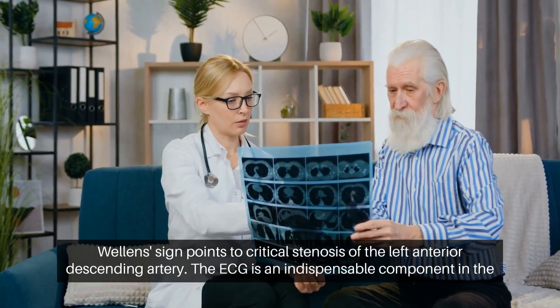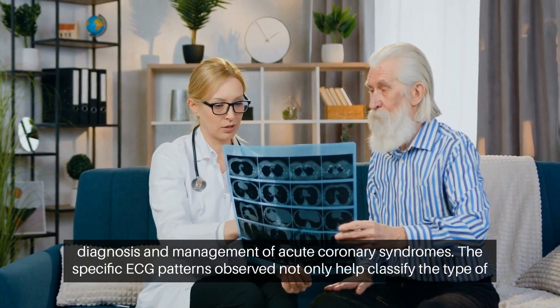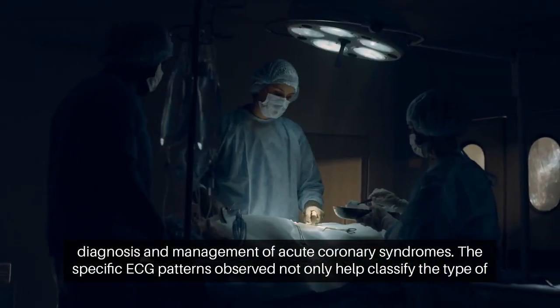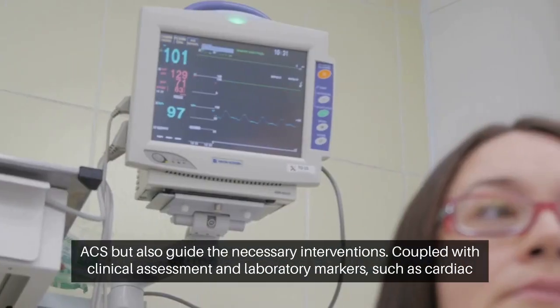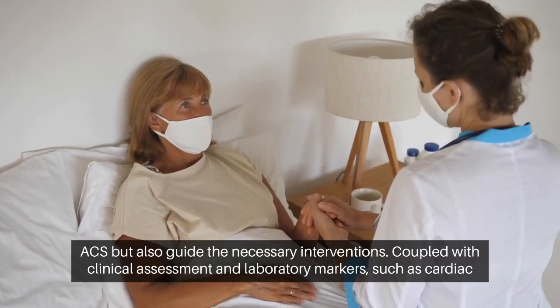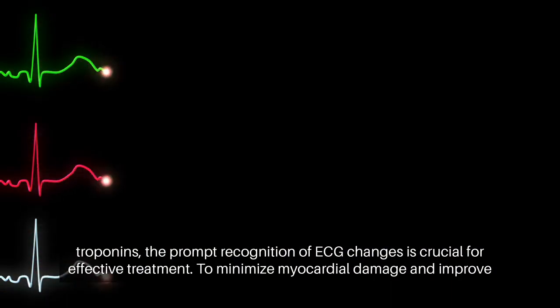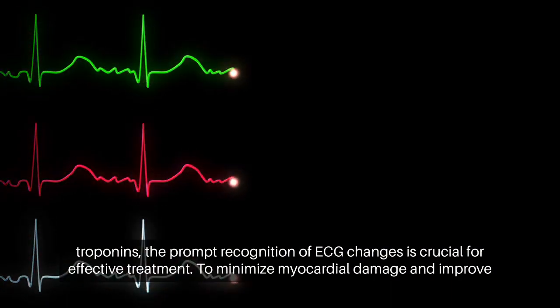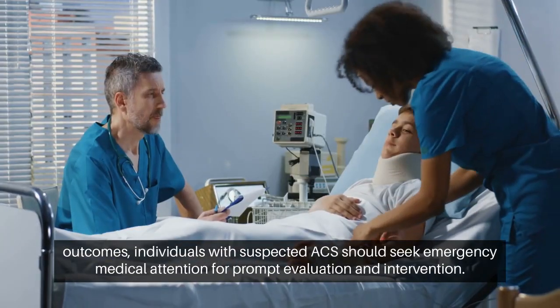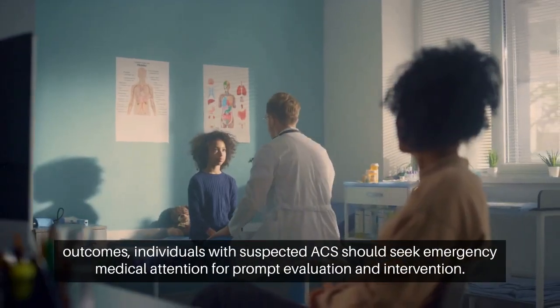The ECG is an indispensable component in the diagnosis and management of acute coronary syndromes. The specific ECG patterns observed not only help classify the type of ACS, but also guide the necessary interventions. Coupled with clinical assessment and laboratory markers such as cardiac troponins, the prompt recognition of ECG changes is crucial for effective treatment. To minimize myocardial damage and improve outcomes, individuals with suspected ACS should seek emergency medical attention for prompt evaluation and intervention.